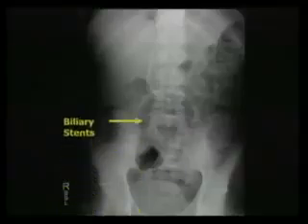What are these things, interventional people? Biliary stents. Everybody, students, you guys in the back, you know what this is right here, students?